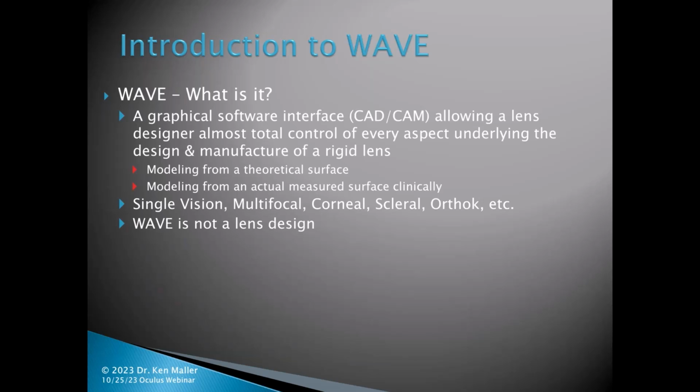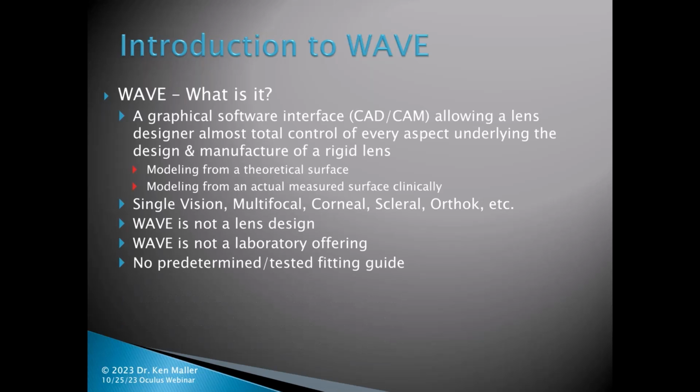But it's important to remember Wave is not a lens design. Wave is really just software. Wave isn't a laboratory offering, so it's not like you call up and say, I want a Wave lens. That doesn't mean anything. Because it's not a lens design or something from the lab, there really isn't any predetermined fitting guide as you are accustomed to with other lens platforms.